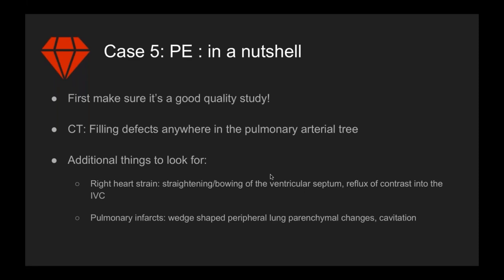The other things you want to look out for are things like right heart strain. And how does that look? Well, it's straightening or bowing of the intraventricular septum, and reflux of contrast into the IVC can also tell you that there's a degree of right heart strain.